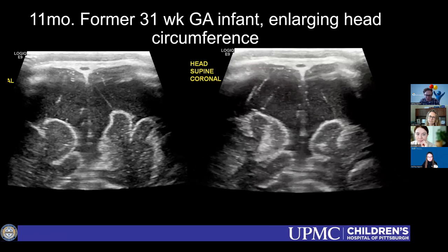I don't think that our neurologist or anybody actually uses that number for counseling, but that was at least one other facet when we were introducing those extraaxial space measurements. It still potentially has some implications for preterm infants as well as these benign macrocrania patients.